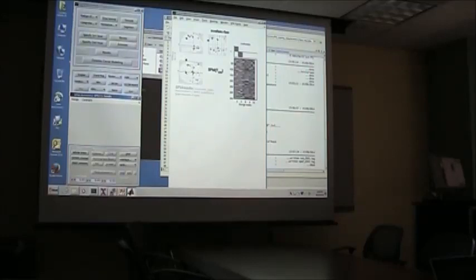It's not really relevant here, this is just for one subject, but on a group level this will become relevant. We often see that if you just lower the threshold, you do get these clusters outside the brain, purely based on noise.